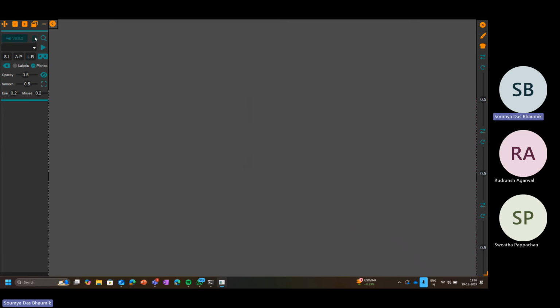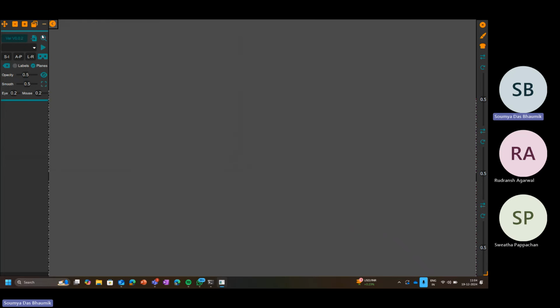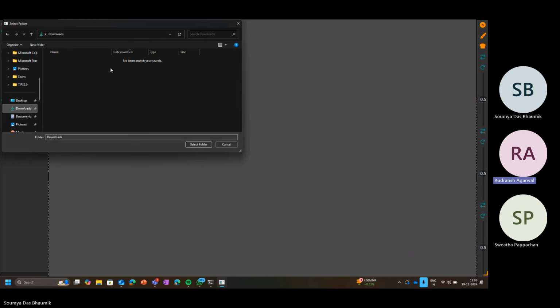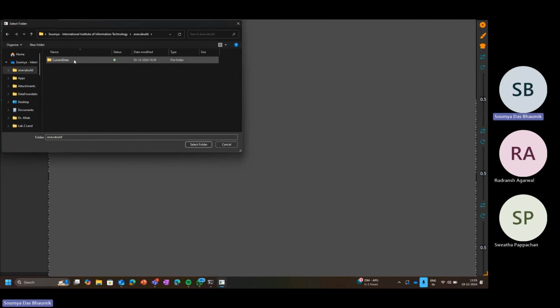Actually, I think I had it. So go to C drive. It is under the AnaVu folder, right? Okay. There'll be a folder where all the lessons will be present. I'm just trying to recall where I kept it. Current data, right? Okay, so just select this.